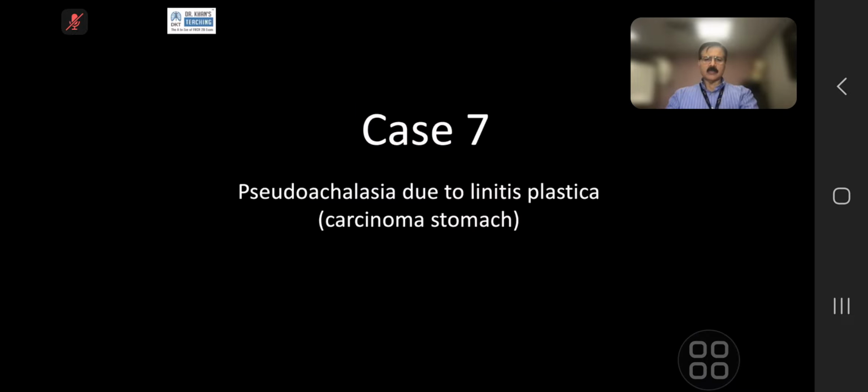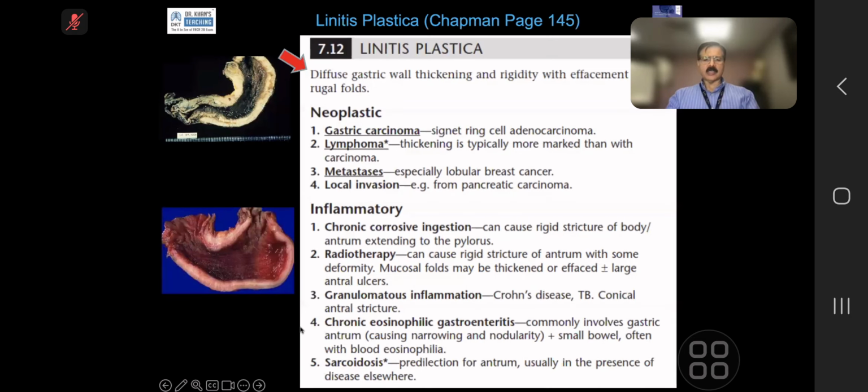Now, this is pseudoachalasia due to linitis plastica, carcinoma stomach. Now, a few things. Linitis plastica. What is linitis plastica? Look at this picture. And look at this picture.